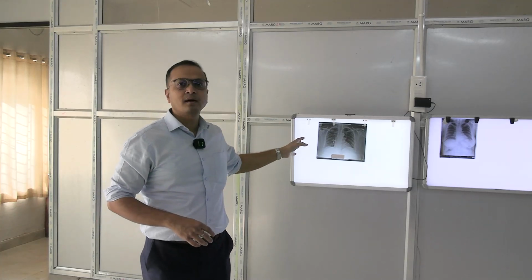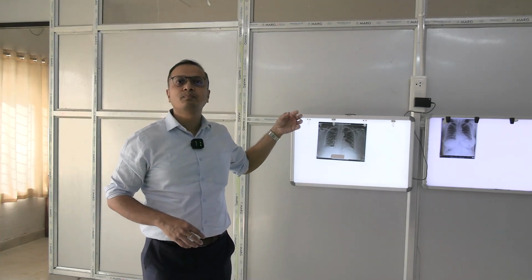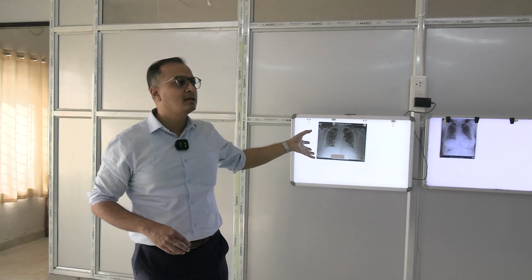And the next thing is that once you have these particular views, what you are seeing out here, which region is it showing? If it is thorax, we have to mention thorax or thoracic region. If it is the whole thorax, we stop at that point. If it is abdomen, we say this is abdomen. If it is upper limb, lower limb, etc. And on that part, you have to say which subparts you are seeing here. If the whole upper limb is visible, we call it the whole upper limb.